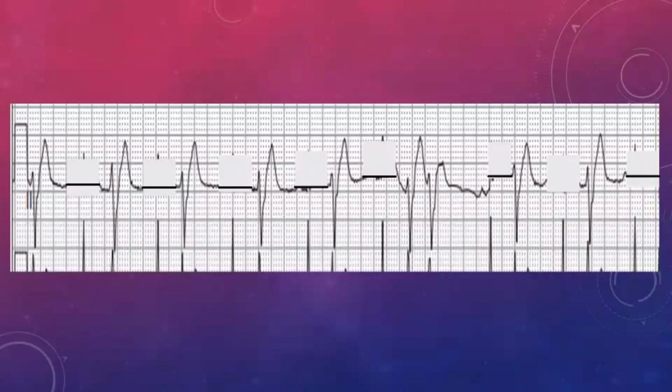I'll talk about the ventricular rate. But we can see that they're also coming in at about 50 beats per minute. So you've got 50 beats per minute coming from the atrium, and you've got 50 beats per minute coming from the ventricle. And you'll notice that it tends to precede or follow a normal one, all right?